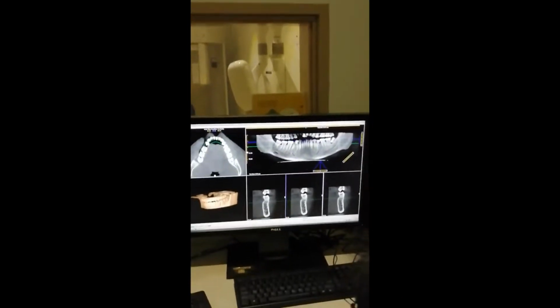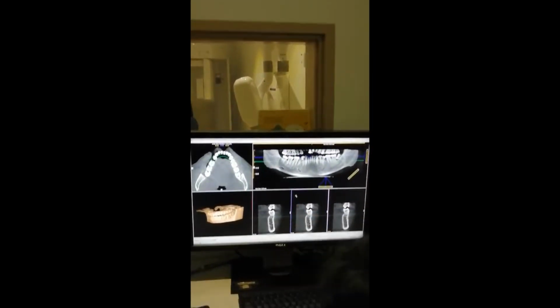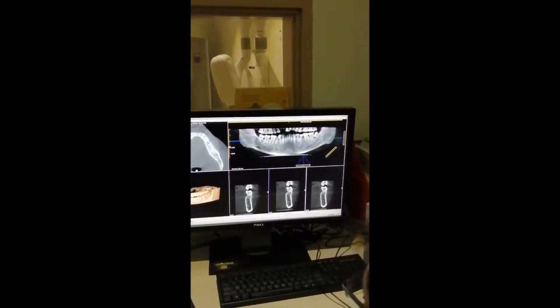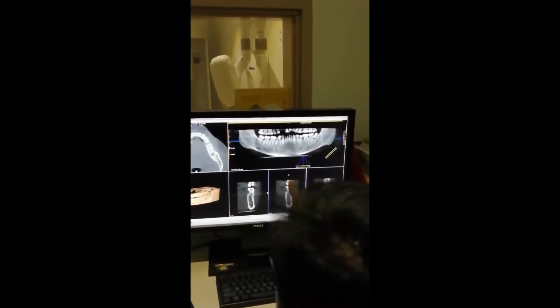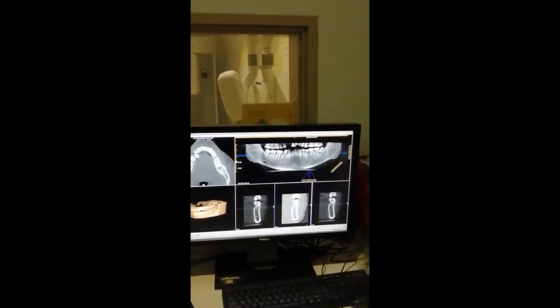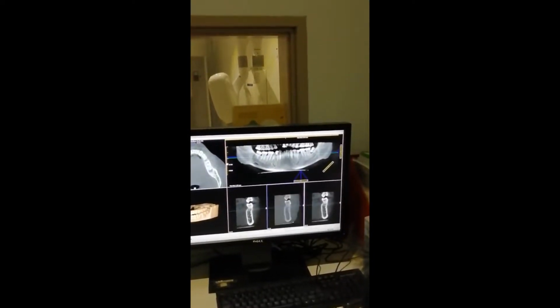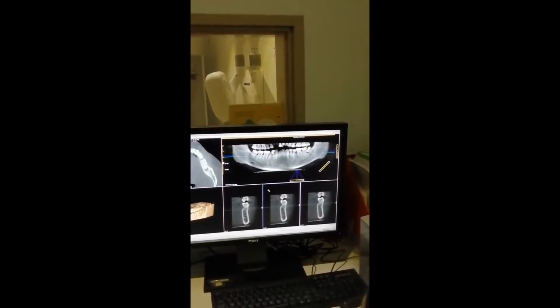Now, a few other things I had to show you. If I move this cursor here and there, we get different letters here. See, it gives P. That means if I left click and then move, I can move this. Position can be altered, but it's not much use. If I move it further, now it is coming WL. That means window level. The contrast and density can be altered. See, brightness. We can do whichever is convenient for us. That is window level. This was position.